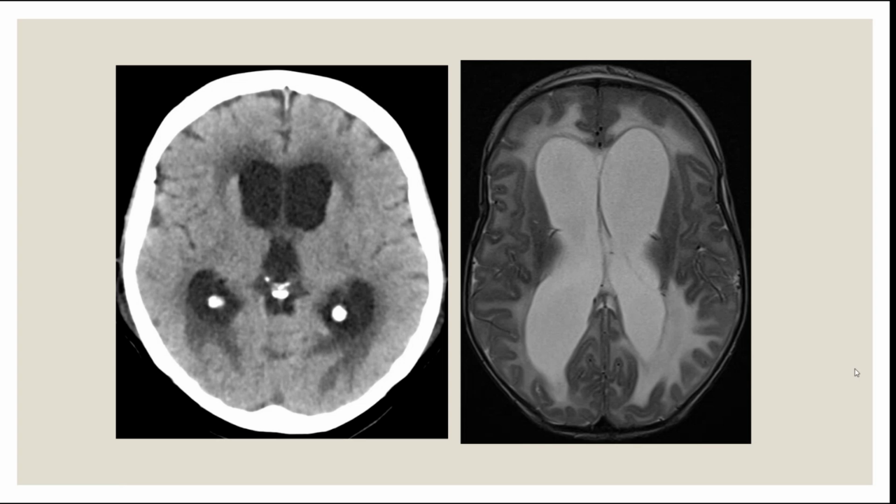Exactly. Actually, both are hydrocephalus. It's the same thing. The same diagnosis looks a bit different in different techniques, but both of them are hydrocephalus. There is dilation of the ventricles. And there is an important thing that you need to know in both CT and MRI.